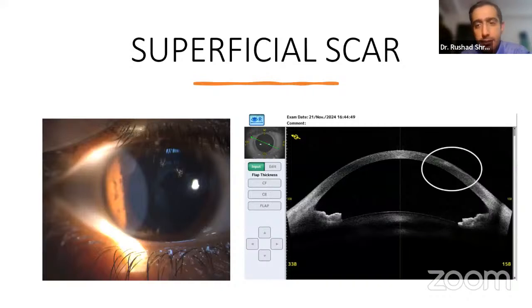Coming to the cornea, one very important fact is that you can denote the level of scarring. Here, there's a hyperreflective band suggesting the corneal scar, which is seen nicely on the slit lamp image as a coin-shaped lesion on the upper temporal side. If you look at this arrow over here, it tells you the direction in which the OCT scan is taken, because it takes a 360 view of the same thing. Now, it's important in corneal scars because it tells you the depth. Very often on slit lamp, we manage to get a gross assessment of the depth, but the actual depth helps to guide the treatment that you would do.